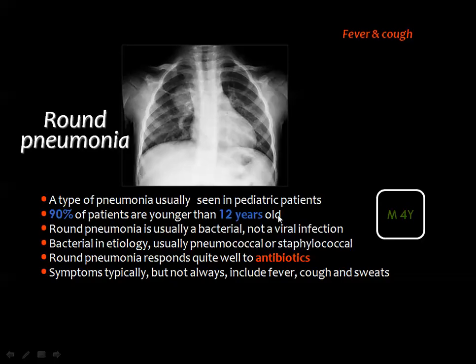if you have adequate clinical data in the form of signs of infection, fever and cough, and a rounded lesion in the lung, whether it is the size of a nodule or the size of a mass. Then if you are going to diagnose round pneumonia, you should know that this lesion is caused by bacteria and is treated by antibiotics.